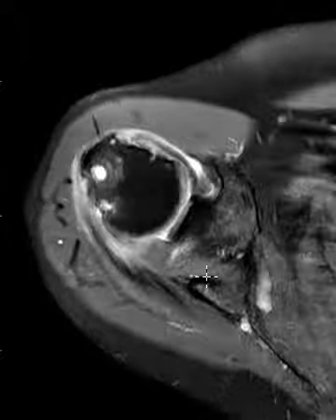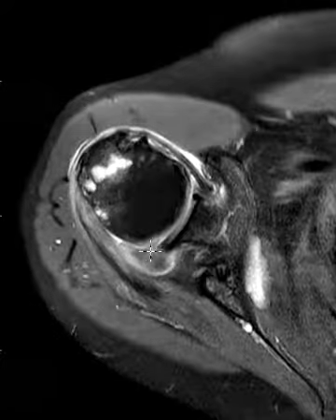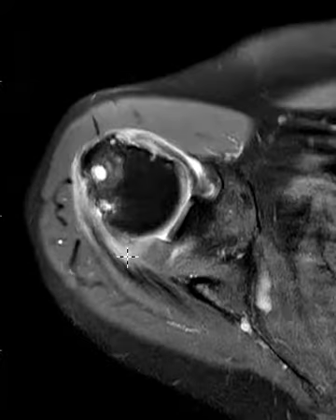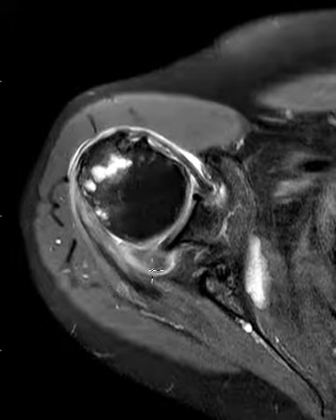On this one view, you say, well, they did fall recently. This could be a hematoma, could be some synovial pseudomass, or some synovial proliferation. But it does mirror fat on this. Here's suppressed fat, and there it is.